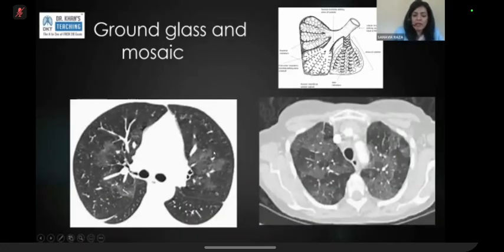When you have ground glass change, the thing to notice is, is the lung next to it normal? If you think that the ground glass is abnormal, you have to look at the lung next to it. Is the black too black, or is the black normal lung? In most cases, it will be normal lung. In some cases, the black will be too black and the white will be too white. That very starkly different attenuation between parenchyma next to each other can be very striking to look at. And that is what is typically described as mosaic attenuation.